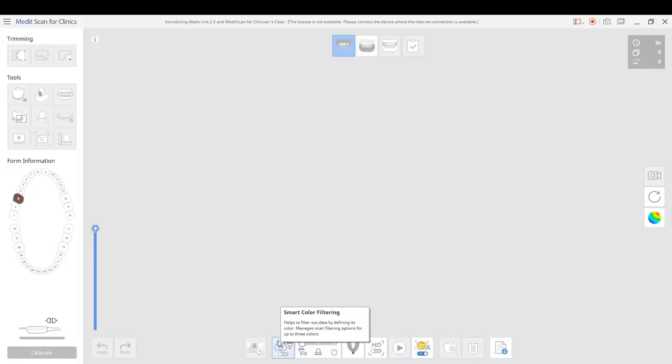And what you want to do is use the colors that are in the spectrum of the green, blue, indigo, and violet color range, as opposed to red, orange, yellow, that are basically things you'd find in tooth structure and gum tissue. So this is a phenomenal filter, very popular. It's caught on quite a lot for users, and it gives us a lot of advantages.